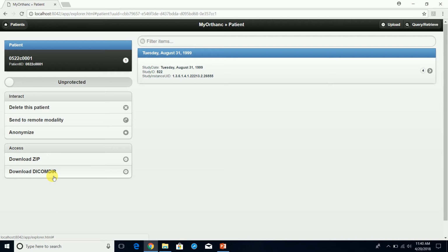Typically, a PACS system has the ability to burn a CD, or the PACS system can send the study to a CD burner, where the CD burner will actually burn the images, the study, onto a CD. Those images that get burnt onto a CD normally have a DICOMDIR, DICOM directory, which is just the structure for the DICOM directory. Maybe we'll be able to run through an example of that. Let's do that here, just for an example, so we can see.